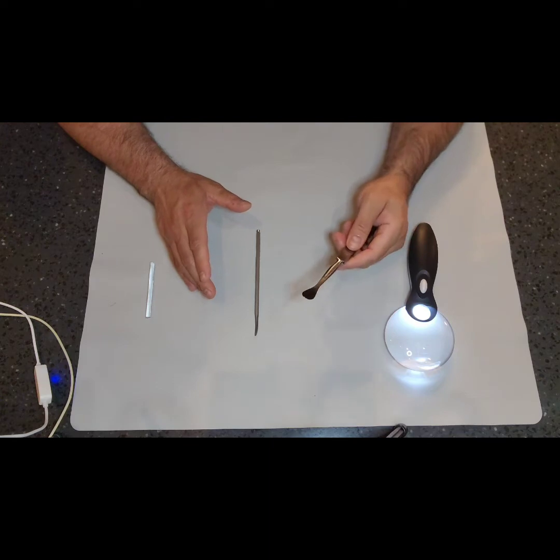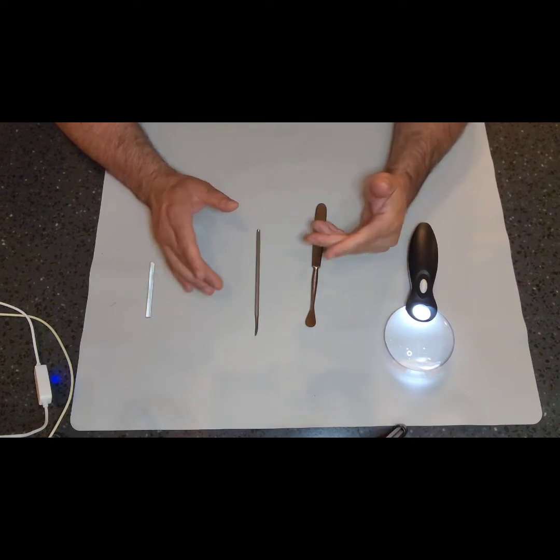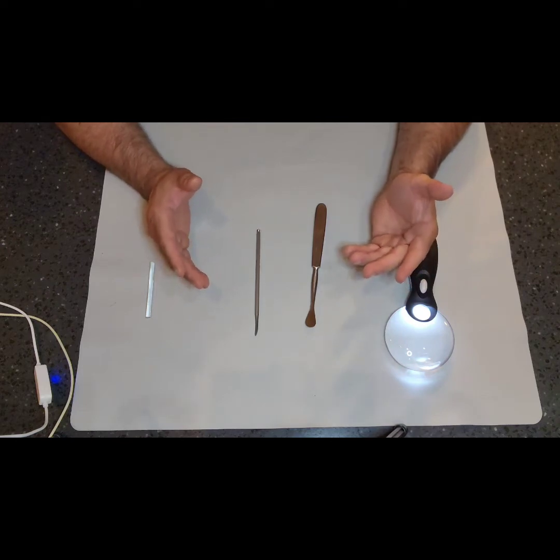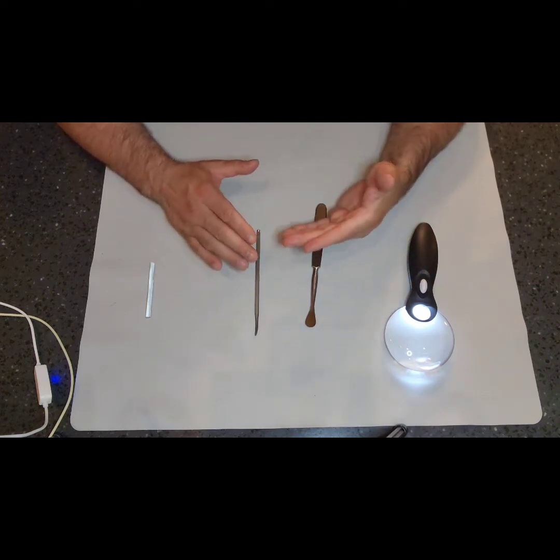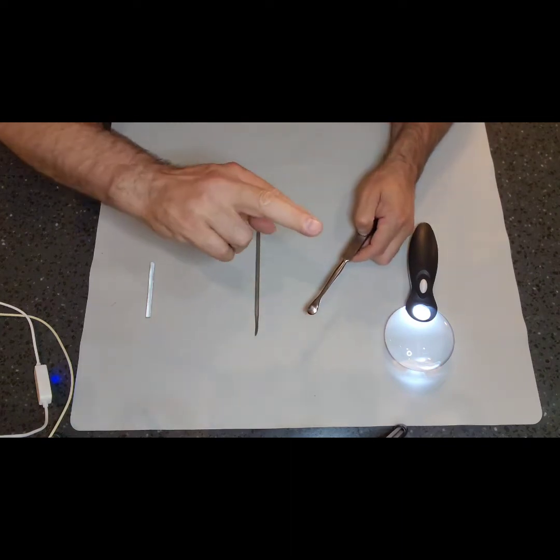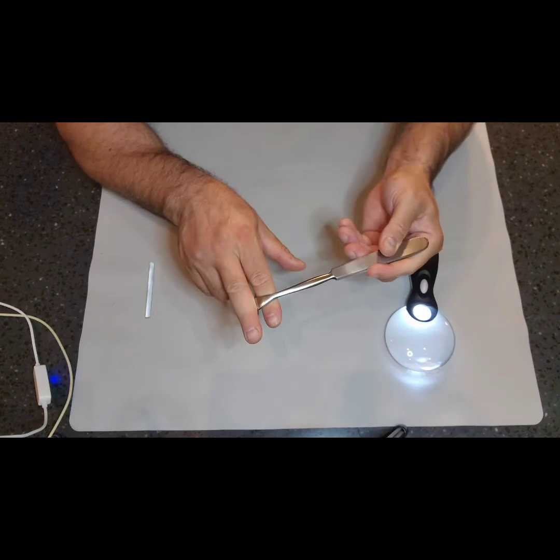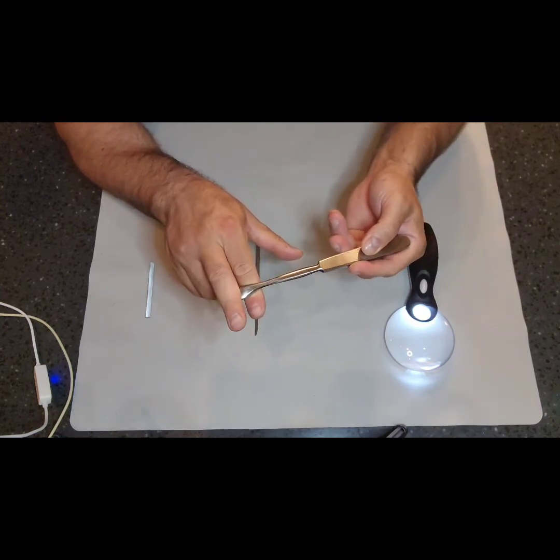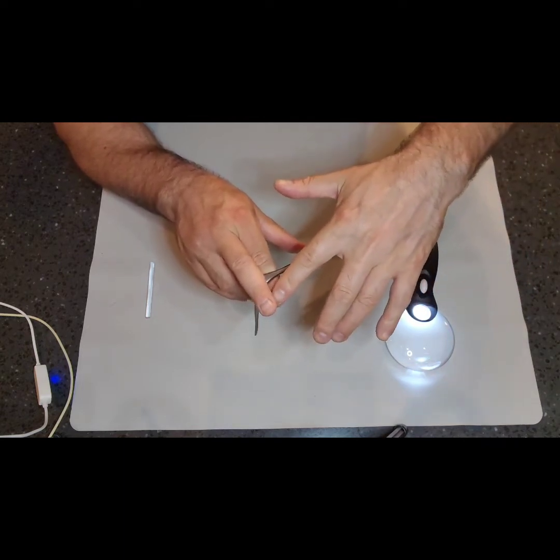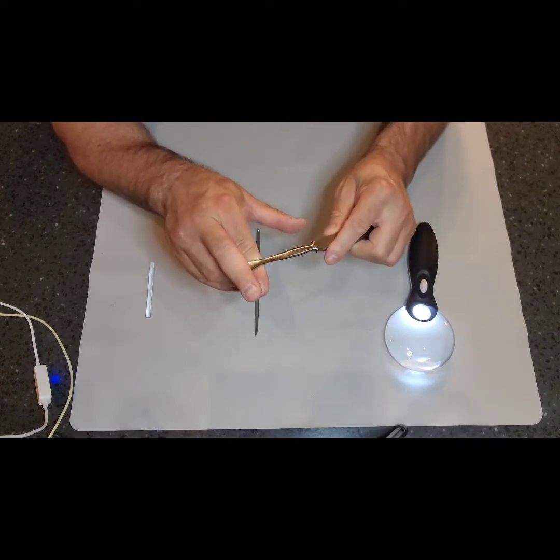So take this one here for example. The most common elevator you can think of is a periosteal elevator, right? So what does it do? The instruments are designed to elevate or to dissect a tissue off of another. Imagine two organs next to you. An elevator is used to elevate one piece of tissue over the other, whether it's a bone or a muscle, so that you can get under there. It's not meant to hold in place because it's not a retractor, but it's meant to move it out of the way, right?